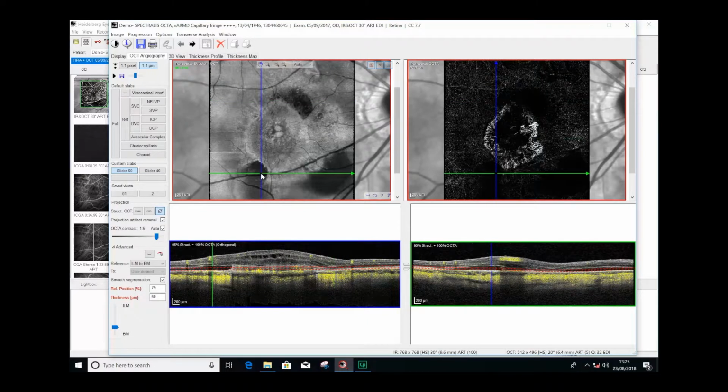An interesting point has been made about how to determine activity on OCT angiography. Some would argue that a lacy fine vessel fringe to an OCTA-derived neovascular membrane would denote signs of activity. This is yet to be shown to be a very reproducible or reliable sign. As a word of caution, it's sensible not to rely upon these signs as of yet as absolute predictors of activity of a disease process.